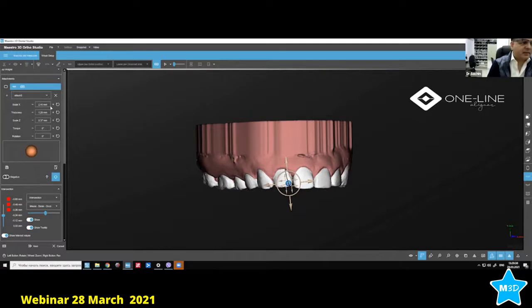So the third is the oval attachment. Okay, fourth one, I don't really use this one. Not this one as well. Seven, no. I think the most common, which will be for the rotation, will be the first one, or you can use optimized root control or ellipsoid. Okay, any questions? Please just write down.